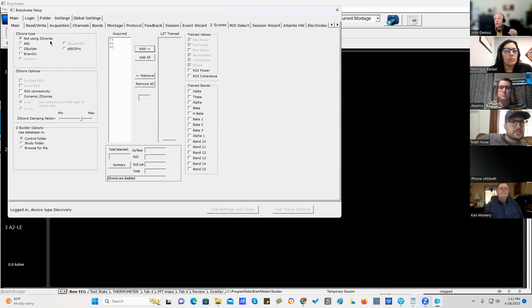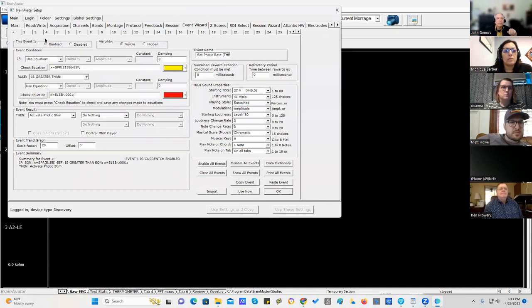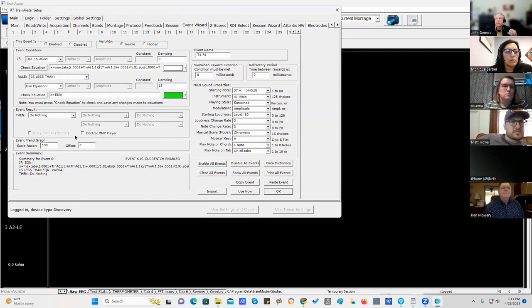And I told you this was Z-score training because Jules Z-score trainings aren't listed. So where are the data? Let me show you. Can everybody see my mouse? I'm going to move it to the right. Please watch it. Please watch it. It's still going. That's the Z-scores. They're embedded in the event wizard. That is Jules Z-score training, which is rigid.